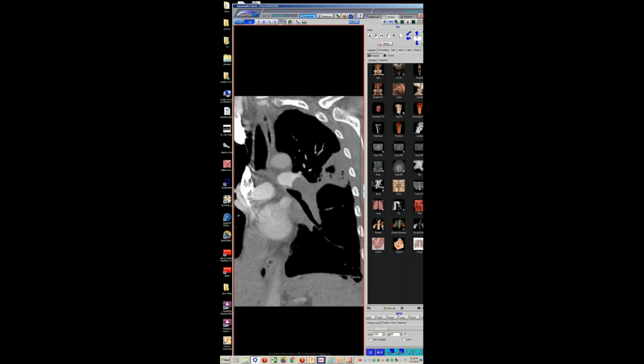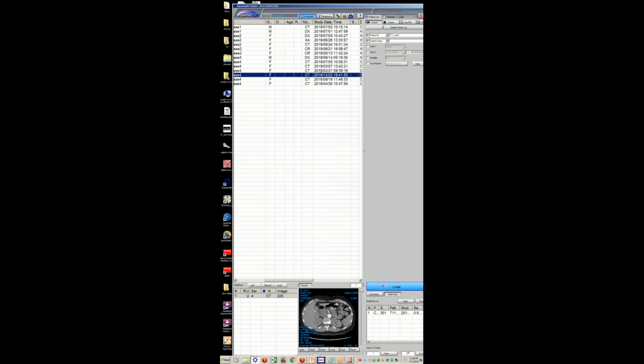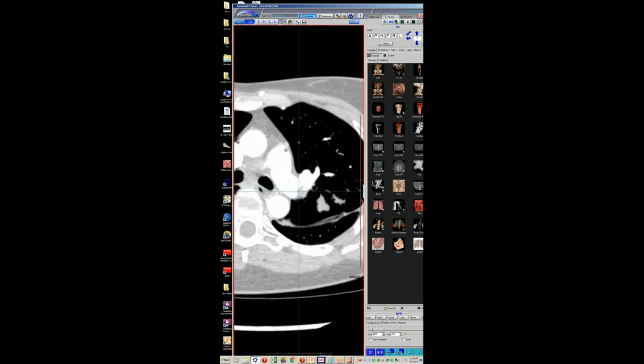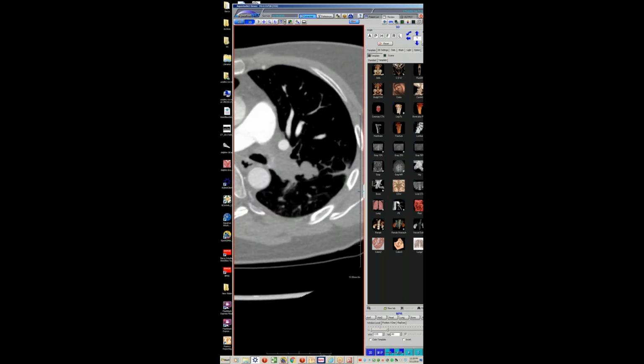And believe it or not, on the outside, this was still called persistent pulmonary embolus. And then she came here, and we did some. It kept growing, and it kept growing outside the vessels, and you can see that all these vessels are expanded. It's growing out. Unfortunately, they biopsied this. Well, they didn't biopsy. They took her for endarterectomy.